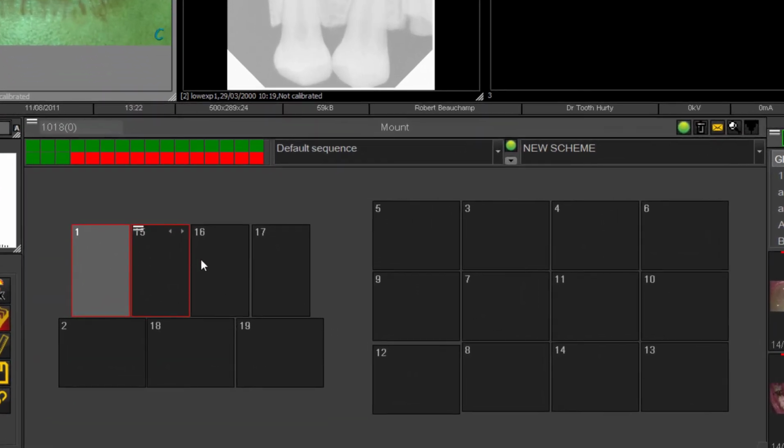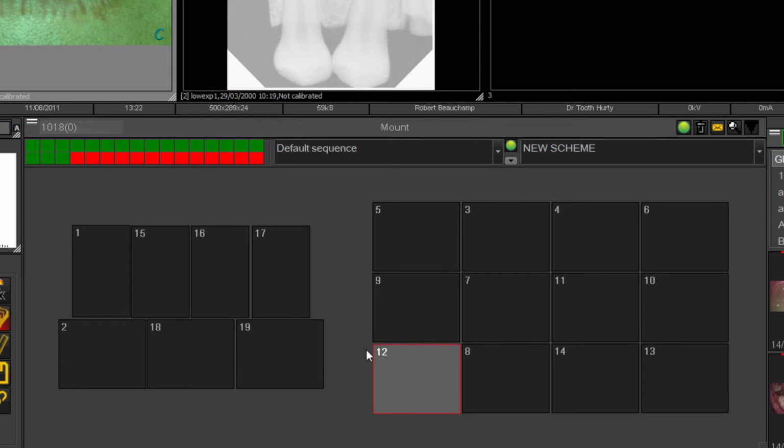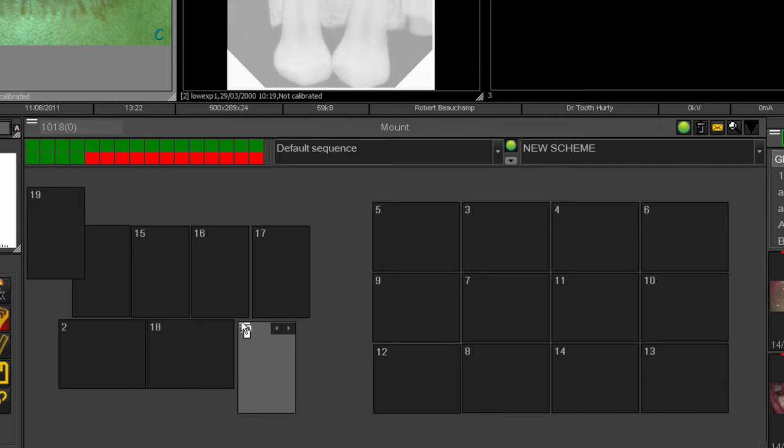And when I click on any of the boxes, you're going to see the two lines in the top left corner that allow me to move these boxes around. So this is where if I wanted to modify this scheme, I could, okay? If you want to add boxes, this is what the green and red boxes are here that you see. And just by clicking on the red, you will remove the last box that was added. And by clicking again, you can add additional boxes, okay?